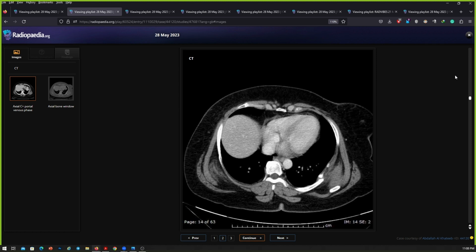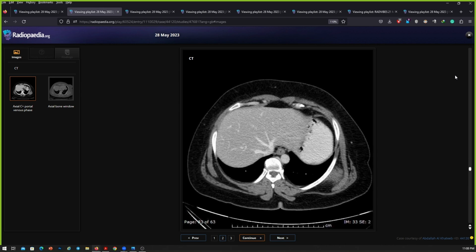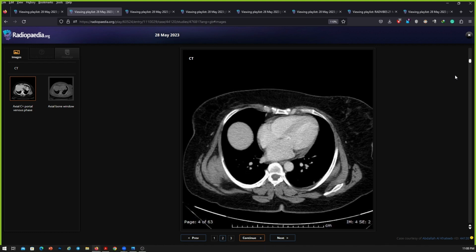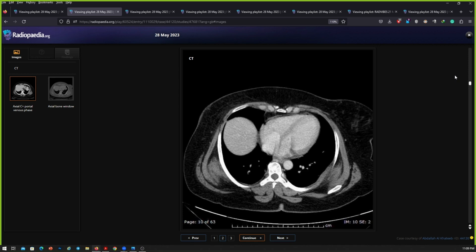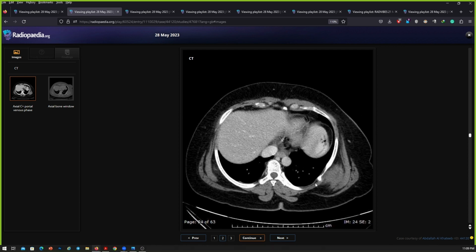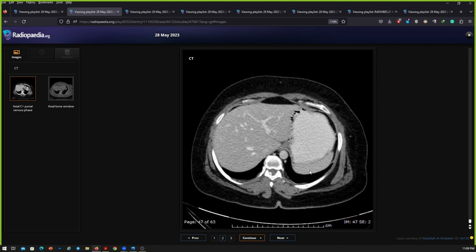Okay. So I'm presented with the post contrast CT scan chest as well as abdomen of a skeletally mature patient whose history has not been provided. So it's not including the whole abdomen, it's basically the upper abdomen and lower chest. Okay, so I'll just go through the images first before I can make any further comments. I can appreciate that there are bilateral soft tissue density lesions which are noted along the lateral thoracic walls bilaterally. Could you point it out to us? Yes. On the right side, it's over here, and on the left side, it's over here. And there is also an associated rib fracture. I think it is one of the lower thoracic left-sided ribs. I'm not sure which level, because it does not include the whole study.